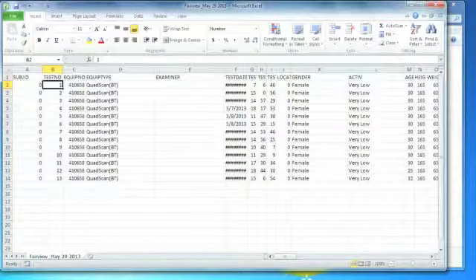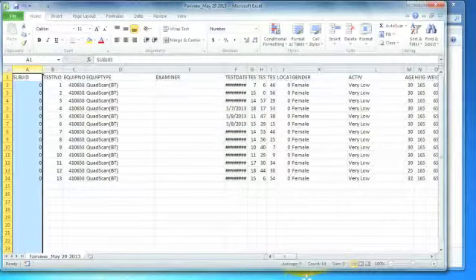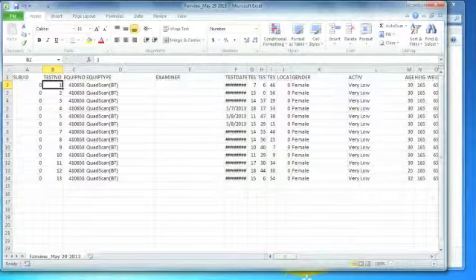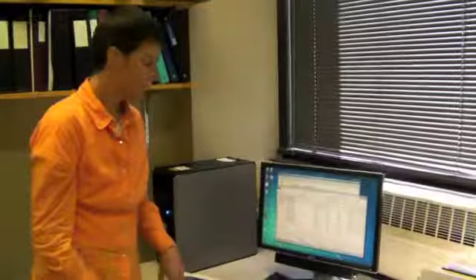So by test number 1, whatever your system for naming subject IDs, and I believe that Rupinder said that she'll be giving those numbers in terms of a standardized way, so every site will have those study subject IDs designated. You'll type that in, okay? So this is critical before you save and send this Excel file to me, that it is trackable to a particular study subject ID. And that's it.